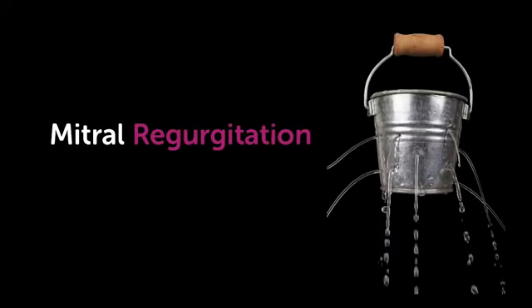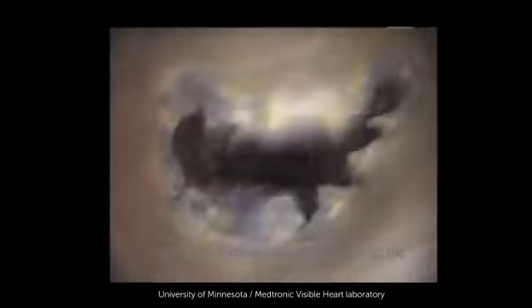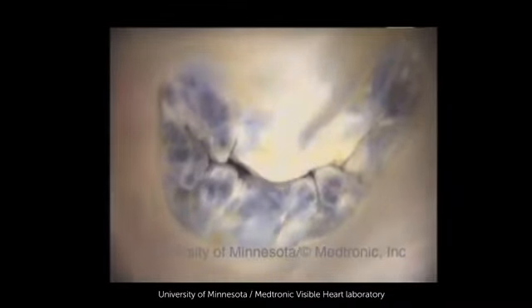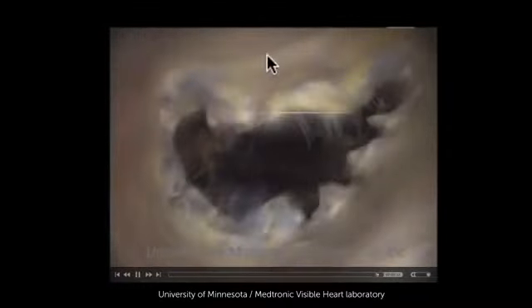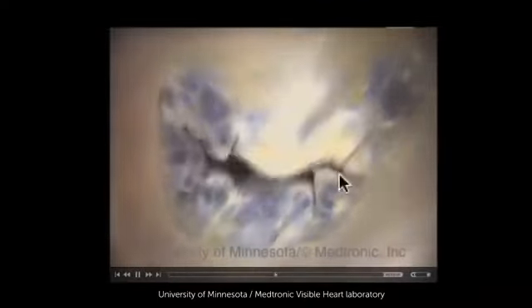But now let me turn to the second most common valvular defect, to mitral regurgitation. Significant mitral regurgitation occurs in approximately 2% of the population. Again, I want to start with a video clip showing the mitral valve in motion. This is the view from the left atrium. You can tell that we have two leaflets, an anterior leaflet and a posterior leaflet, where the anterior leaflet is longer. However, the posterior leaflet takes on more of the circumference of the mitral valve and therefore has about the same area as the anterior leaflet.